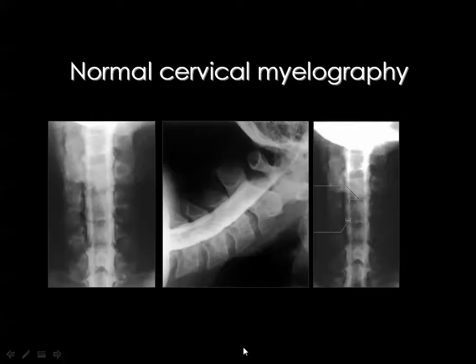In the cervical spine, we may have the frontal view and the lateral view, which is known as the cross table view or lateral view with horizontal beam, aiming at the delineation of the contrast column, which in this position will be dependent inside the spinal canal, lying on the posterior aspect of the vertebrae as well as disc spaces.